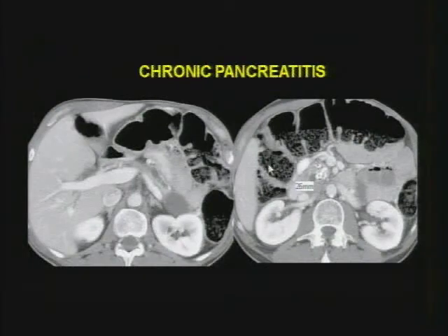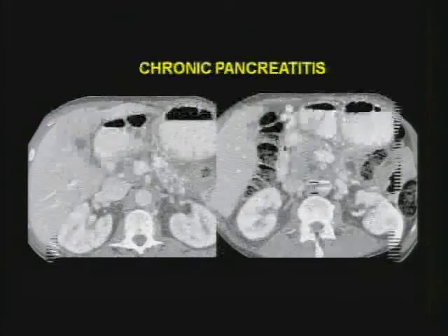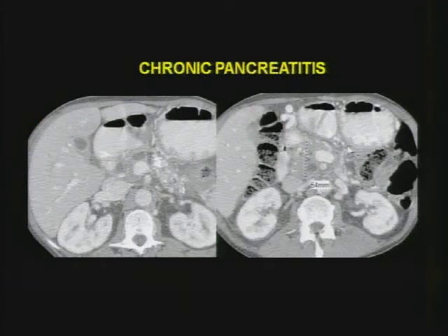And this densely calcified pancreas shows nicely its position in the abdomen, but very unhelpful is ultrasound, where the calcifications will shadow the entire gland out and you won't be able to evaluate at all. Here's a patient with dilatation of the pancreatic duct, and you can see that the head is actually small and measures 2.5 centimeters. Here's a different patient who also has chronic pancreatitis. You can see the calcifications, and this time the head is actually enlarged at 5.4 centimeters.